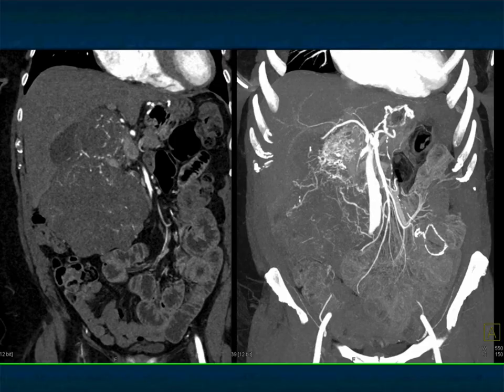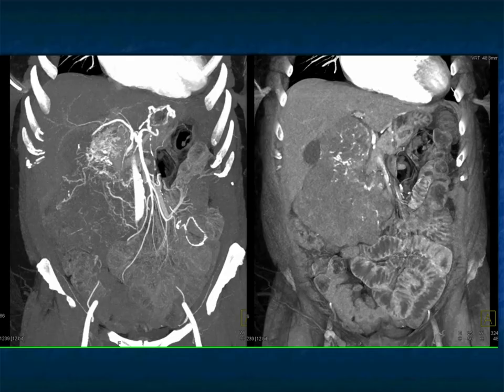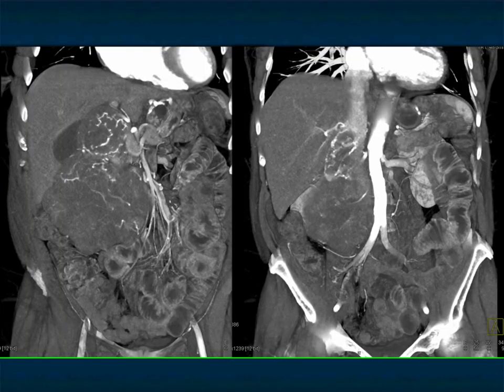And this was an IVC sarcoma, very nicely shown on the patient's coronal views, and on the MIP imaging with the neovascularity is particularly impressive. Here's a few more images showing you that as well. And here again, some volume rendering and some MIP imaging. I think IVC sarcomas at times, to me, when I show them in conference, unless you've seen them before, you never really think of that possibility.